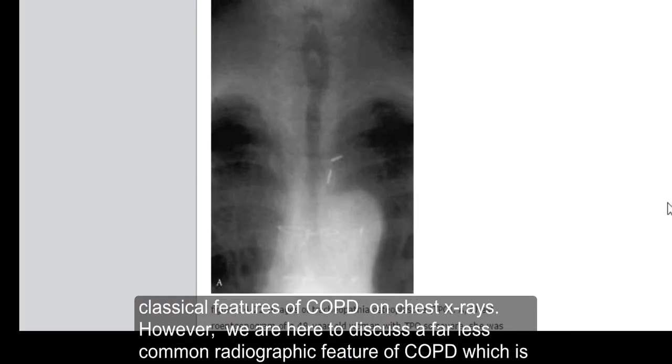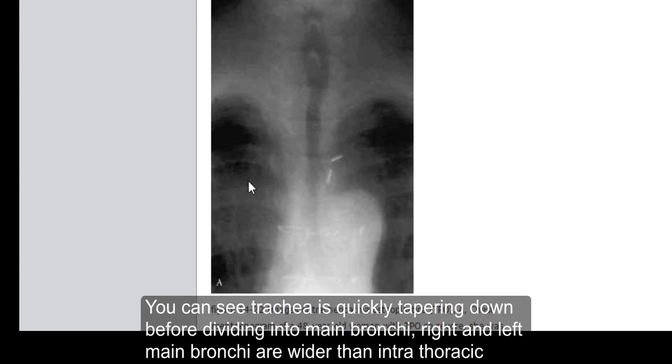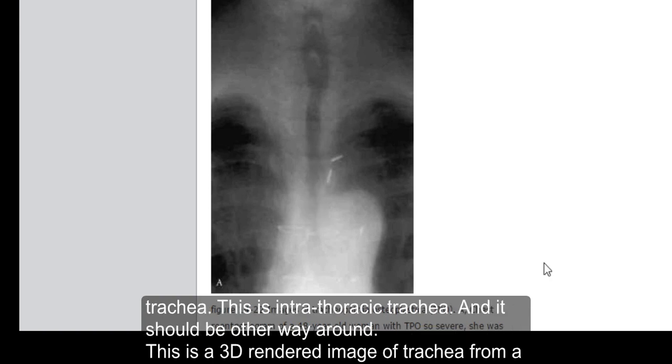However, we are here to discuss a far less common radiographic feature of COPD, which is known as Sabre sheath trachea. The word sabre actually refers to a sword, which is the reason behind such a name, I presume. You can see the trachea is quickly tapering down before dividing into main bronchi. Right and left main bronchi are wider than the intrathoracic trachea. This is the intrathoracic trachea, and it should be the other way around.